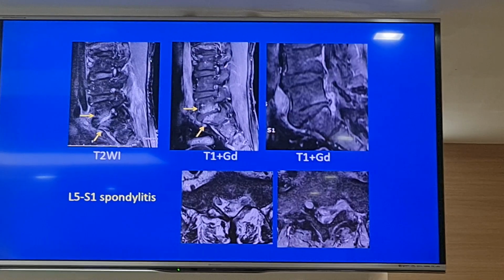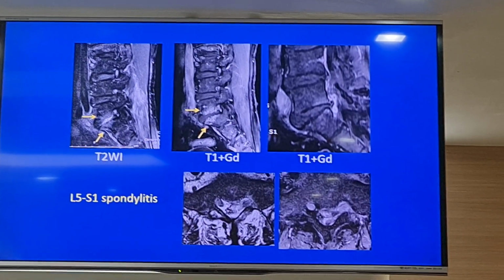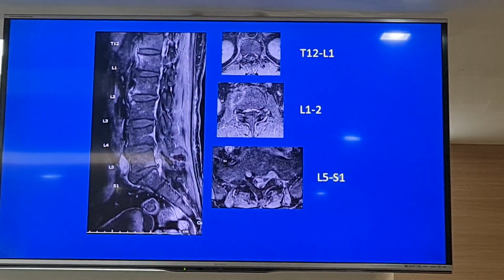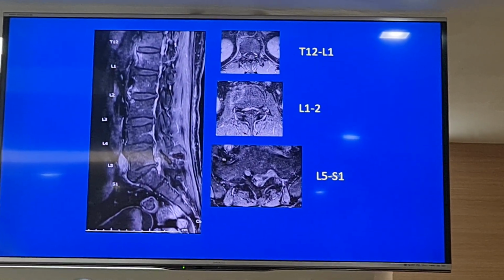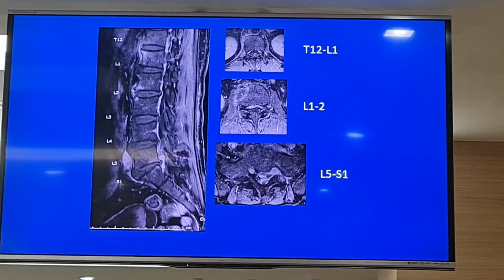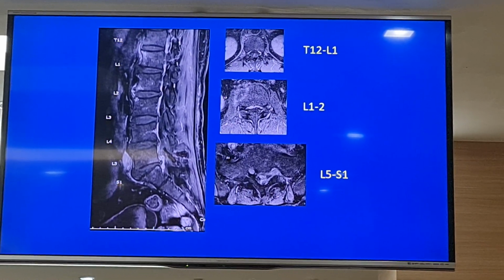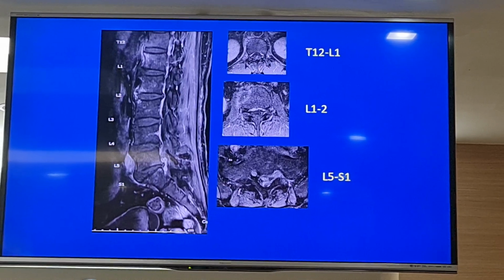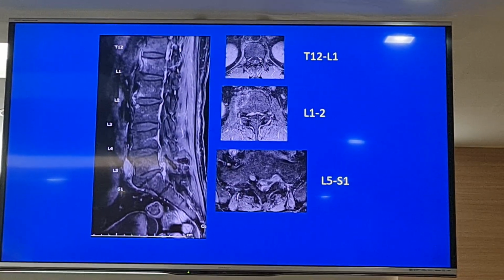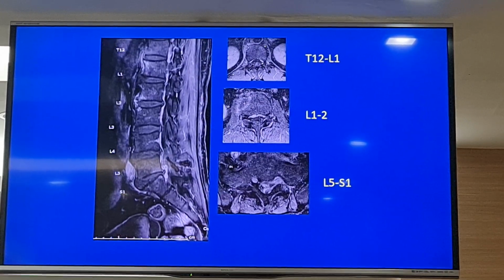It can cause pain because it entraps nerve roots. But it may not be enough to look at only this area, because this is the first inflammatory process that we can detect. You can have all together the other areas that have infection as well.